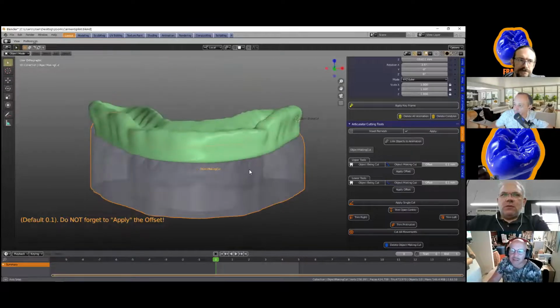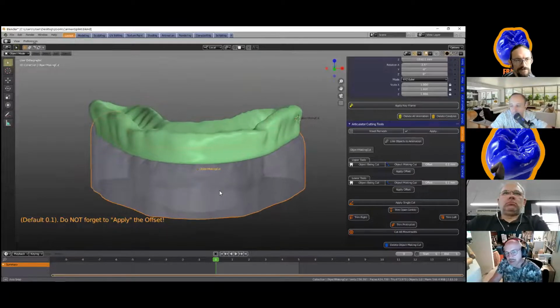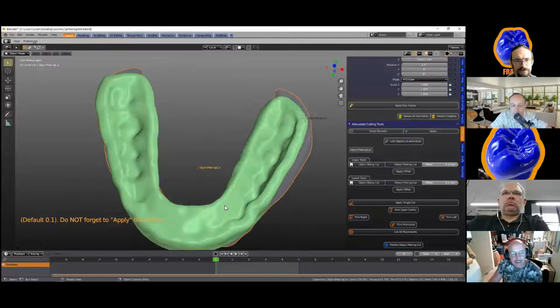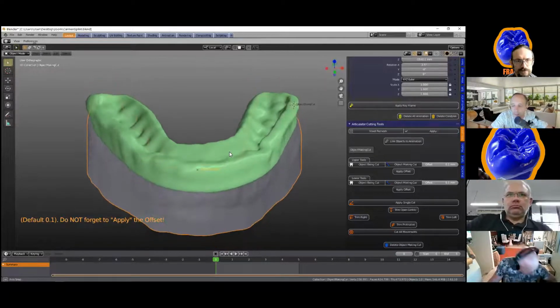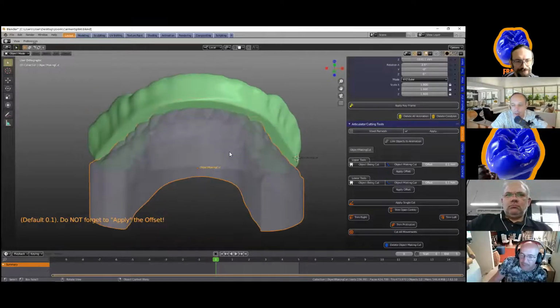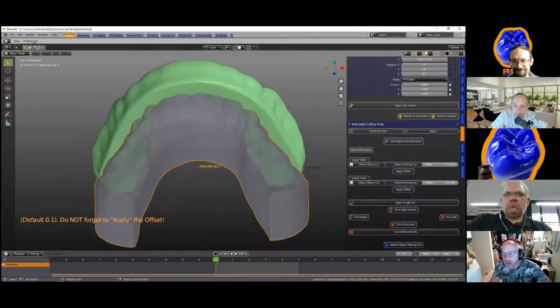We can then see. And by the way, if you think, oh, where's my fitting surface? That's because we leave the cutting of the fitting surface right to the end because we don't want to damage the fitting surface at all. Also, the models disappeared in this process, so don't be alarmed. It's just part of the procedure, so we can focus on what we're doing. So if we just apply a single cut, it should cut out one specific cut.